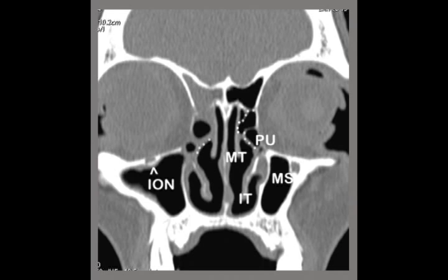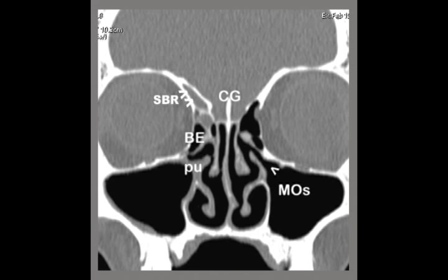That means that the frontal drains medially. On the right side, you are not able to see the complete uncinate, but the horizontal part only is seen attaching itself to the middle turbinate. So here you have to trace the uncinate process from below upwards.